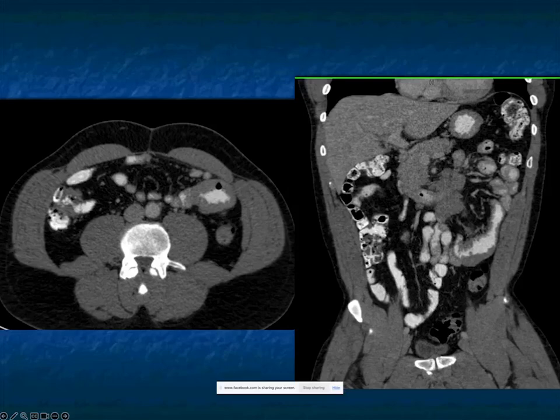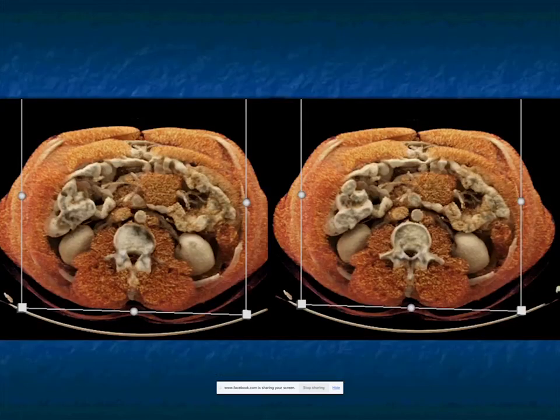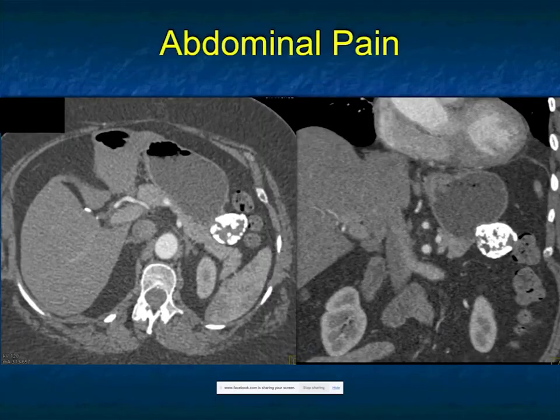However, when you see the mesenteric mass and you see the bowel, I typically don't think about adenocarcinoma. Mets is still a possibility. It's not going to be inflammatory in all likelihood. It's going to be some sort of tumor, and with the mass in the mesentery, 5-centimeter infiltration, paraaortic nodes, here's that mesenteric mass again, the most likely diagnosis is going to be, and is, lymphoma: mesenteric mass, so-called sandwich sign, and the small bowel infiltration.